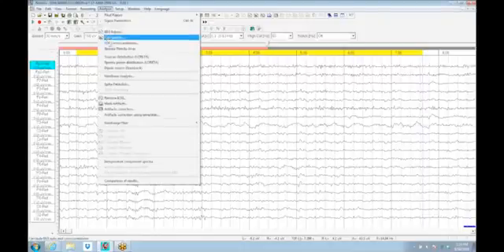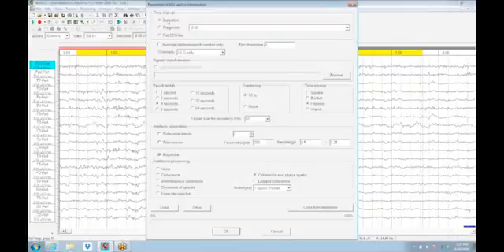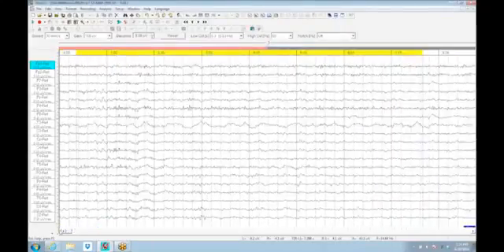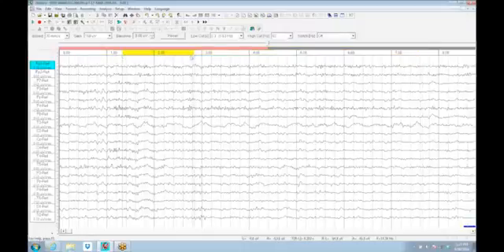So, you're making that selection by left clicking? Yeah, I left mouse click on the timeline to catch the left edge of it, and I right mouse click to catch the right side edge of it. Okay. And if I click down here, it doesn't do that. It has to be up here on the timeline. Great. So I can extend that out or shrink that down to focus on a particular piece of it.